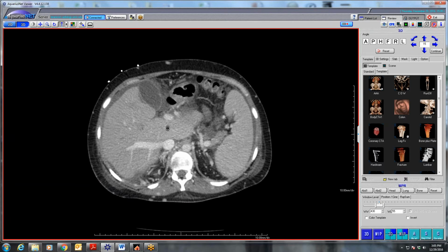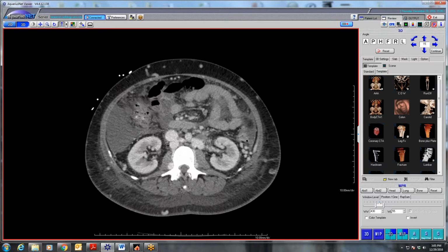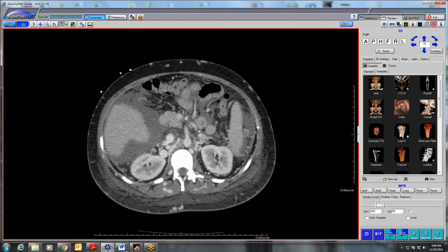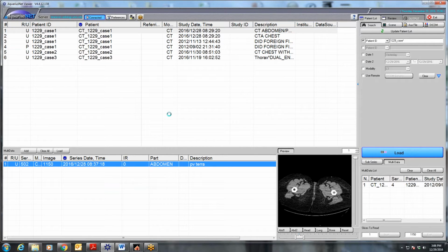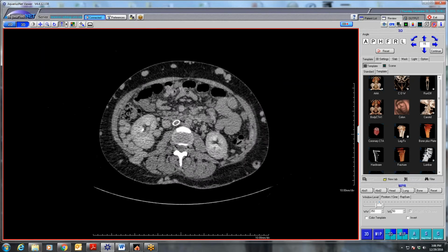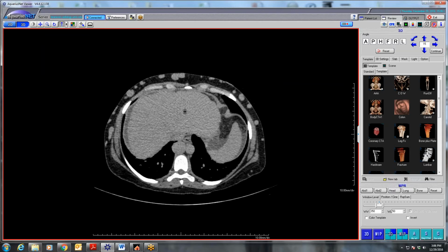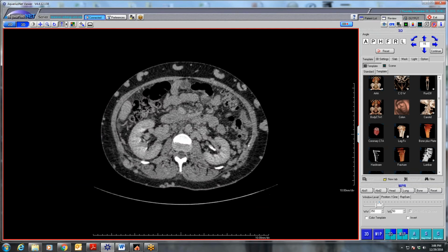It's going from the hepatic veins down to the renal veins and then filling through all these collaterals retrograde. As we go on later in life, they tried to create an IVC in the intrahepatic portion. It didn't work very well. It basically never really opened up, and she's continued to develop these massive collaterals, and it's fascinating.